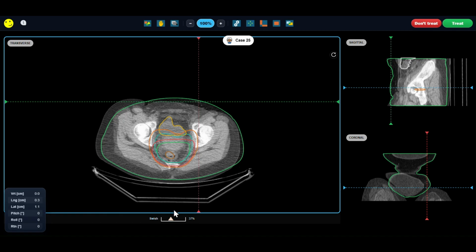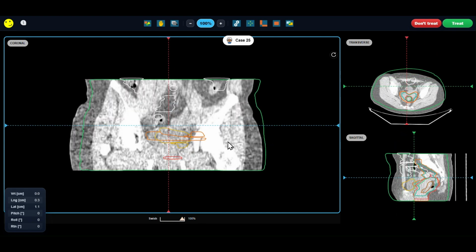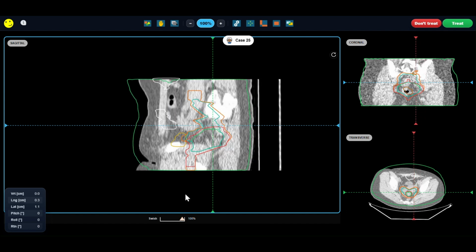So through this case, I'm going to explain the patient diagnosis, the treatment prescription, the meaning of the structures we're matching to, and we'll also walk through with you why this patient should not be treated for the current image. So let's start with the patient information.